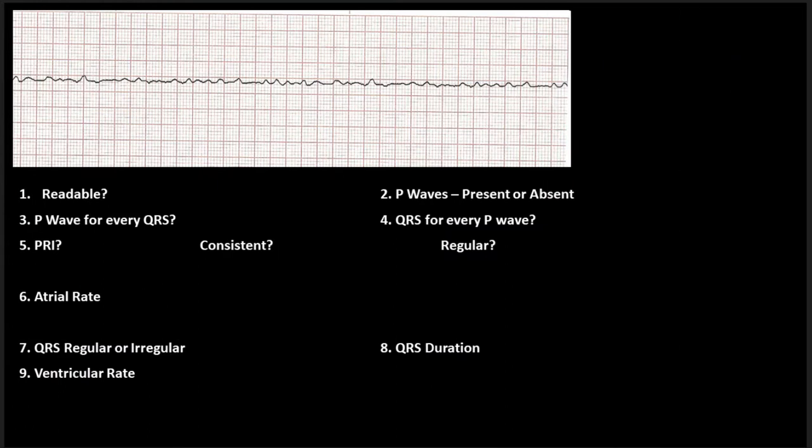So today we're going to take a look at ventricular fibrillation. There are two types of ventricular fibrillation that we would like to focus on. The first one is going to be a fine V fib, and the other one that I'll bring in a little bit later is going to be a coarse V fib. While they're both V fib, they do have a role when it comes to cardiac arrests and shockable rhythms. We're not going to spend a lot of time in this section on that. Just realize that coarse V fib usually responds better to conversion.